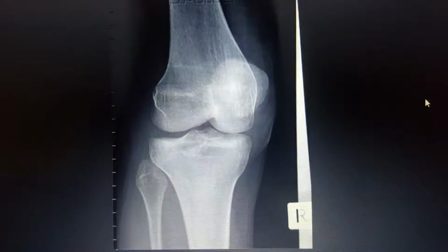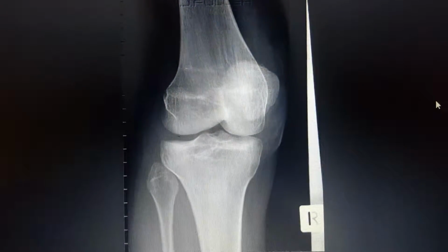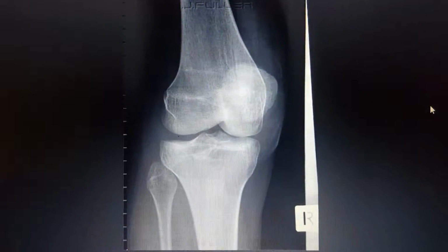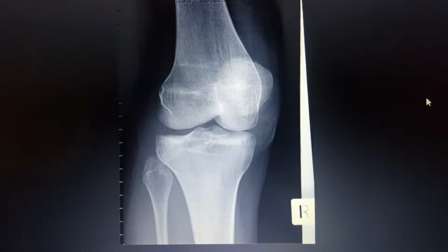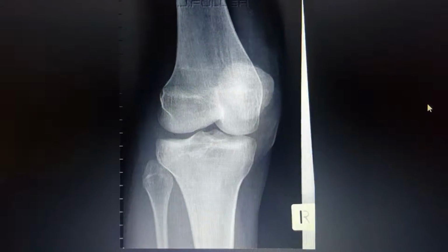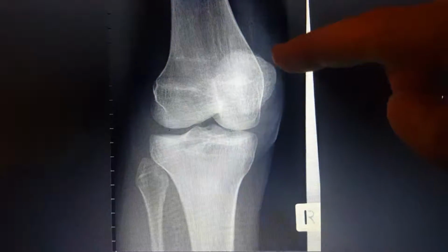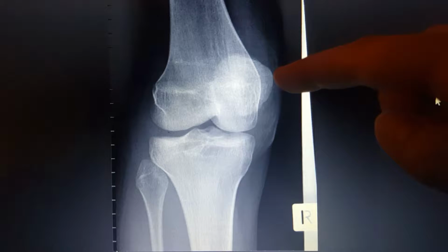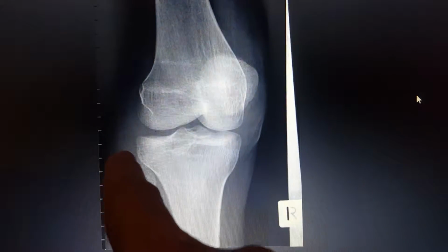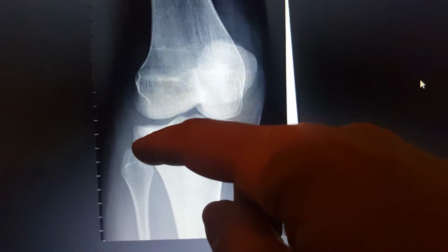Next, I'm going to be discussing the criteria for the AP medial oblique image. As always, you want to make sure that there's a marker in that image. And the anatomy that you're going to see in the medial oblique view is the same anatomy that you'll see in the AP image, except you'll see the patella is on the medial aspect of the femur. You'll be able to see an open tibiofibular joint space and the lateral femoral and tibial condyles.